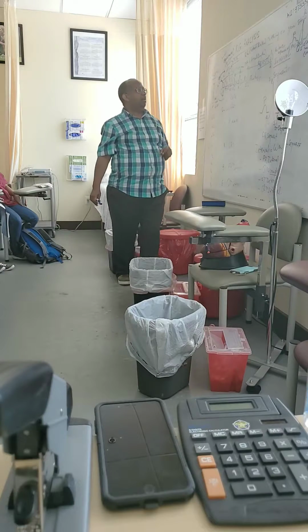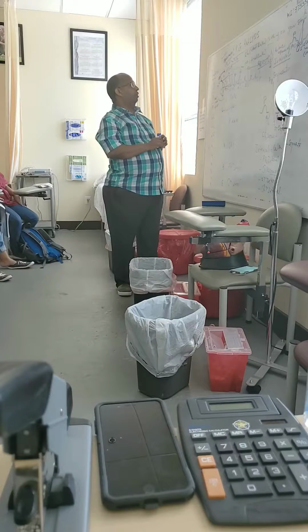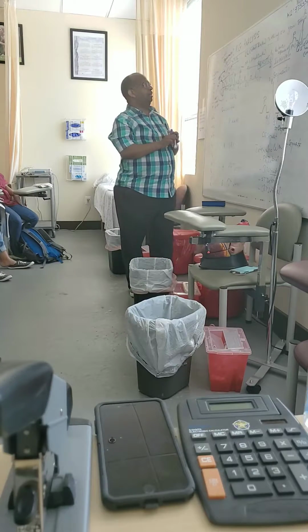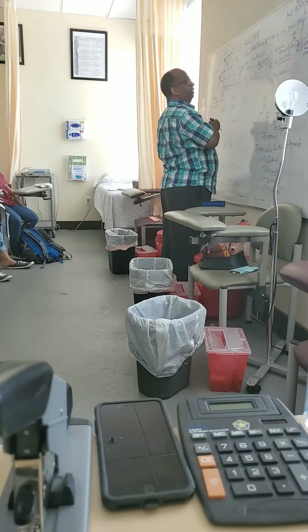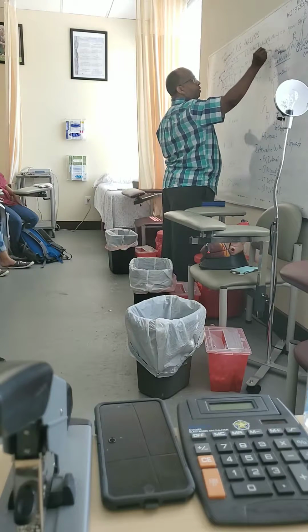With this we determine the rhythm. RR is the ventricular rhythm, PP is the atrial rhythm. If the ventricular rhythm is regular, we call it regular. If it is irregular, we call it irregular. So this one can also be regular or irregular.